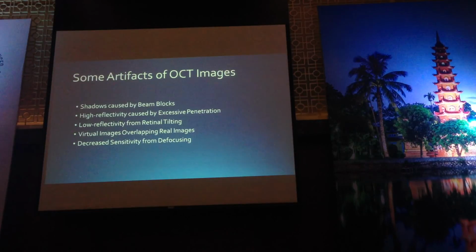I have 15 minutes left. I'm going to spend the rest of my talk on some artifacts that you're going to face with the conventional OCT images that you normally have during your clinical practice.